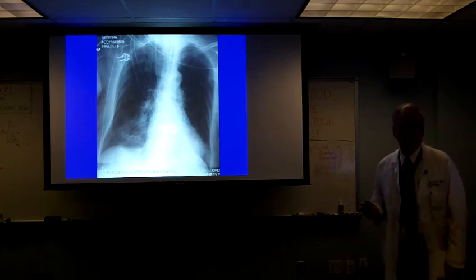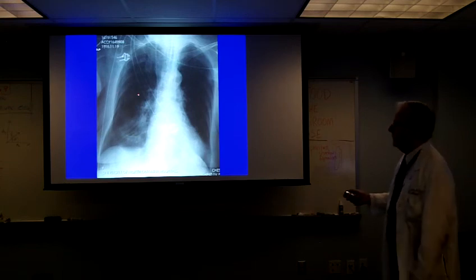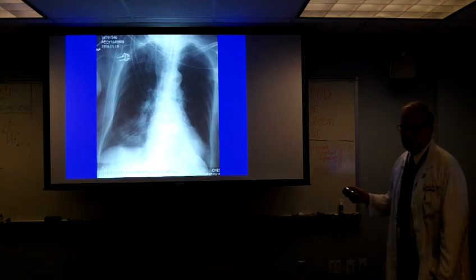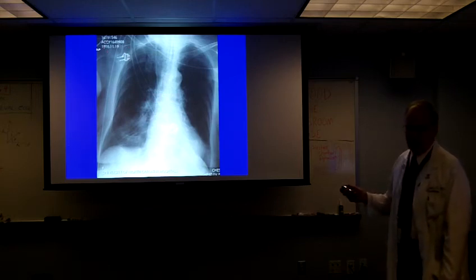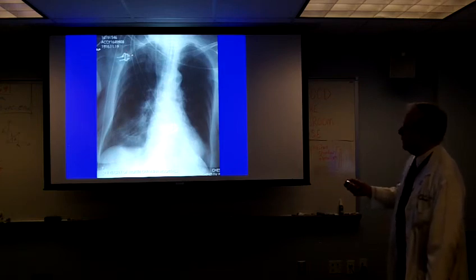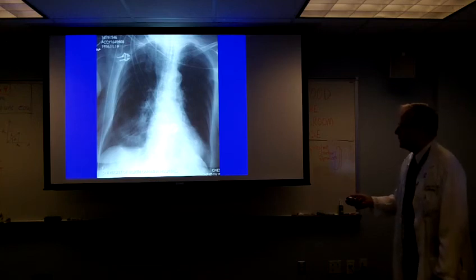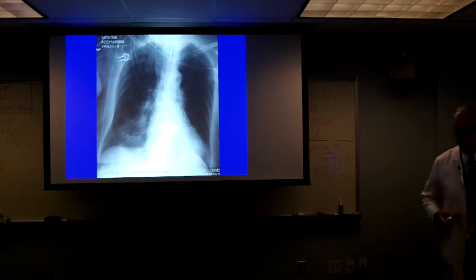It could be a skin fold. Excellent. And you know that because, and this is another point about radiographic technique, Murphy's Law says if there's one spot you need to really visualize well, it'll be right underneath where the EKG electrode connector is. But if that were out of the way, you could see that this line crosses the bony structures of the thorax. Other thing is, if it's a supine film, the air should be down here because that's where the high point in the chest is. So that's where the air will preferentially collect, not out here laterally.